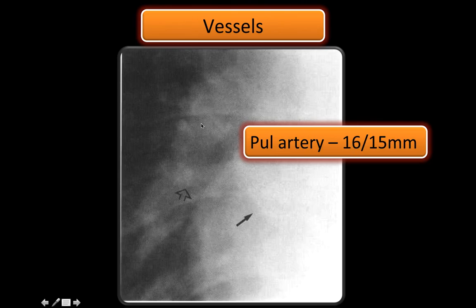If you find it is more than this, then there should be some kind of pulmonary hypertension, whatever may be the cause. This is very important. Most radiologists do not include pulmonary hypertension, and pulmonary hypertension can lead to changes in the lung fields, changes in the heart, and even the clinical features, as the clinicians know much better than me.